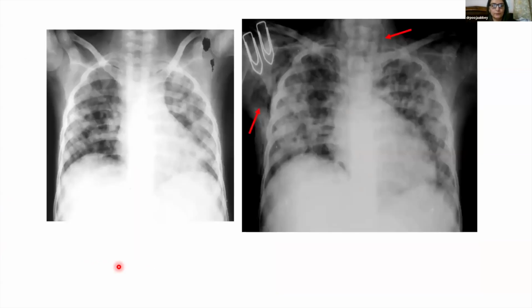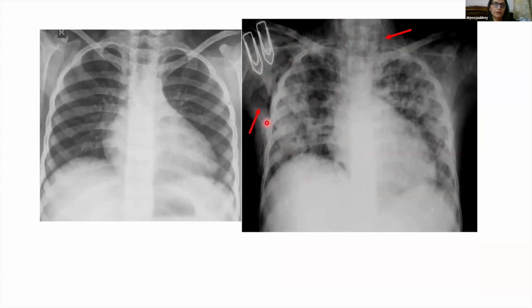So these were some of the radiographs of this child. This was earlier on, before she developed this kind of air leak. And we can see bilateral opacities, infiltrates in bilateral lung fields. And this subsequent radiograph very clearly shows a large area of subcutaneous emphysema and pneumomediastinum and all this kind of air leak. Luckily, this child did well on tuberculosis therapy, and after completion of therapy, her radiograph looks absolutely fantastic and normal. So she did well.